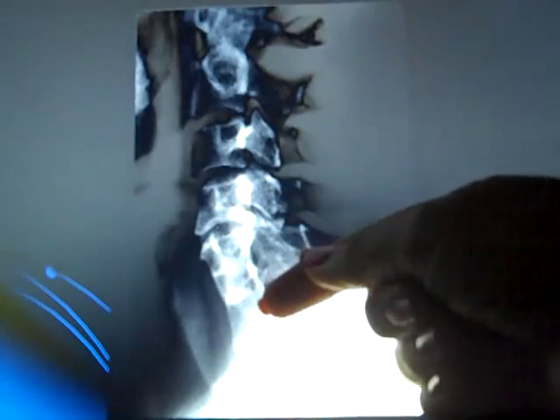This one has the concavity on the anterior surface, and so again this would be a congenital block. A partial congenital, still concave on the anterior surface. This one involves three segment levels, and you see the solid spinal laminar junction line right here.